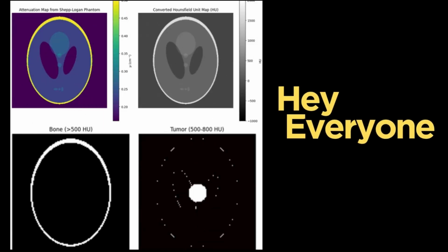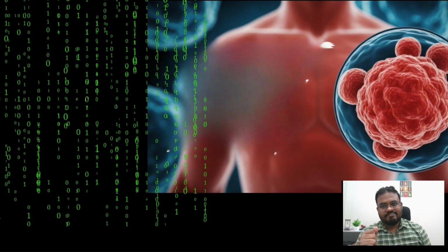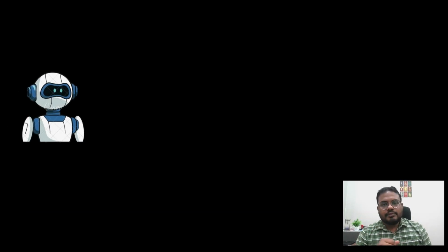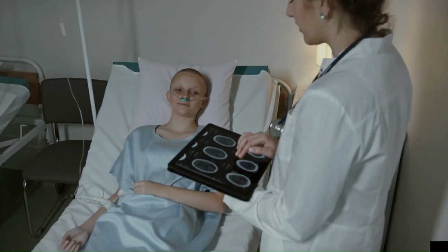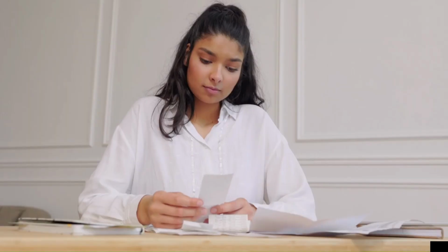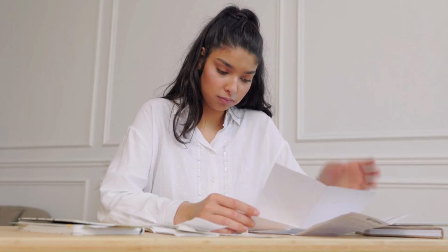Hey everyone, what if I told you a few lines of code can detect cancer in your body? Yes, this is not science fiction. Today you will see how Python code plays a crucial role in detecting diseases like cancer. And don't worry, this is beginner friendly. Even if you have never written a single line of code before, no issues.